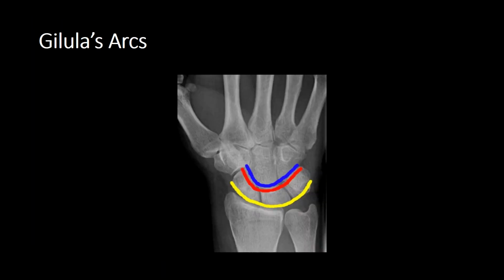The carpus is vulnerable to dislocation as a result of major trauma, and so it is important to evaluate alignment. Now, the normal carpal joint space is 1 to 2 millimeters, and that's exactly the same for the carpo-metacarpal joint. And in the same way, when we're evaluating the base of the 4th and 5th metacarpals for dislocation, what we're looking for is the ability to see a clear joint space without any overlap of the adjacent bones.